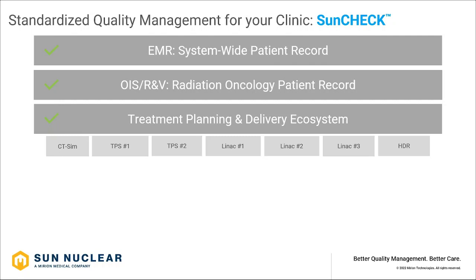Most importantly, it is vendor neutral and it allows you to perform QA independent of any vendor. Our intention is to integrate any of the CT SIMs, any of the treatment planning systems in your clinic, any combination of treatment planning systems, linacs. So if you've got Varian, Elekta, Tomotherapy, Halcyon linacs, these can also be integrated within SunCheck, as well as HDR afterloaders, which are also supported within the SunCheck platform.